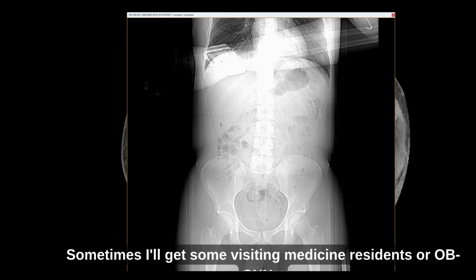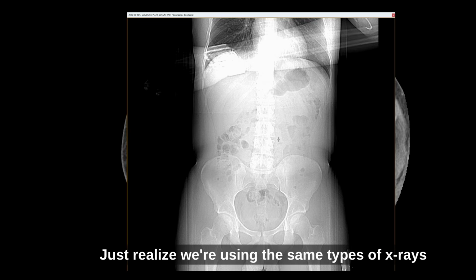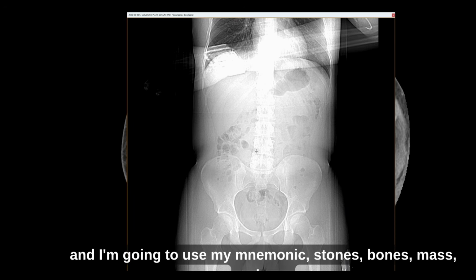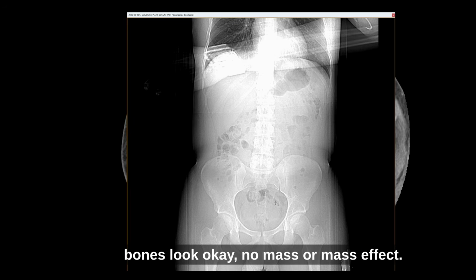Sometimes I'll get some visiting medicine residents or OB-GYNs, and that comes as a shock to some of them. Just realize we're using the same types of x-rays to go through the patient, and we get the scout first. I'm going to use my mnemonic: stones, bones, mass, and gas. Stones, anything radiopaque. I don't see any kidney stones. Bones look okay. No mass or mass effect.